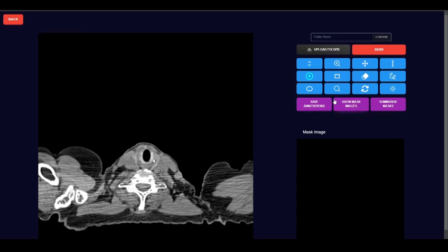Now, like I've stated, we have uploaded a folder of DICOM images, but we are only looking at the first DICOM image here. And to look at every other DICOM image, you're supposed to use this tool called the stack scroll, which basically lets you scroll through every single image. So first, let's enable it, and let's have our mouse in the image region, which is this area.